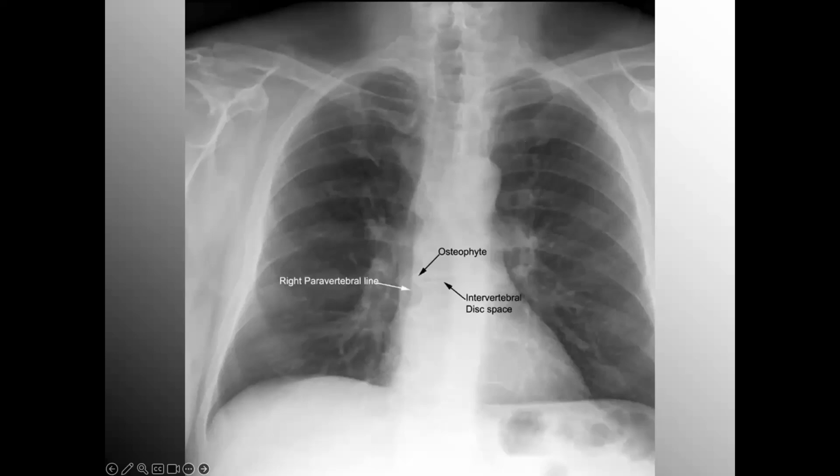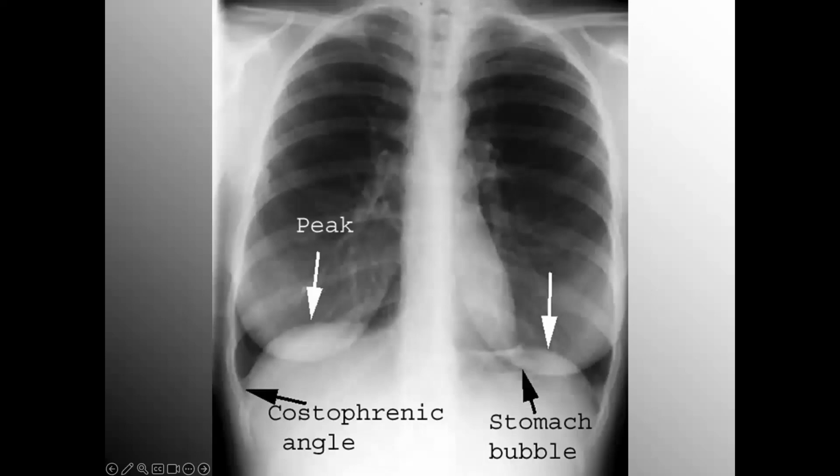Here's just an example of a few more pertinent items of interest. An osteophyte, by the way, is just kind of like a bone spur or a bony outgrowth, very common in arthritis patients, usually from just generalized degeneration of cartilage. So a good example here of the various levels of each hemidiaphragm under normal conditions. Do note that the costophrenic angle, also known as the sulcus, appears to be rounded and almost blunted, but this could be an optical illusion.